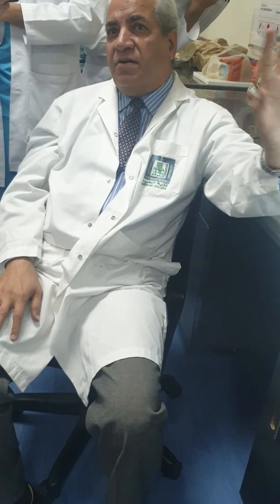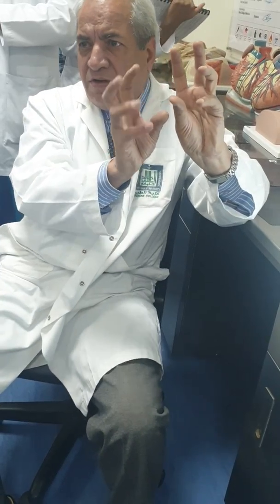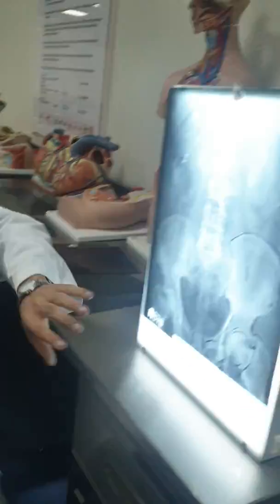Correct. AP, and here also because they are mostly bones, we call it the lateral view also. So usually we see two types of X-ray, either AP or lateral. In some positions you need an oblique view because there are many bones and you want to focus on one bone, you can take the oblique view also. So three things are there here.